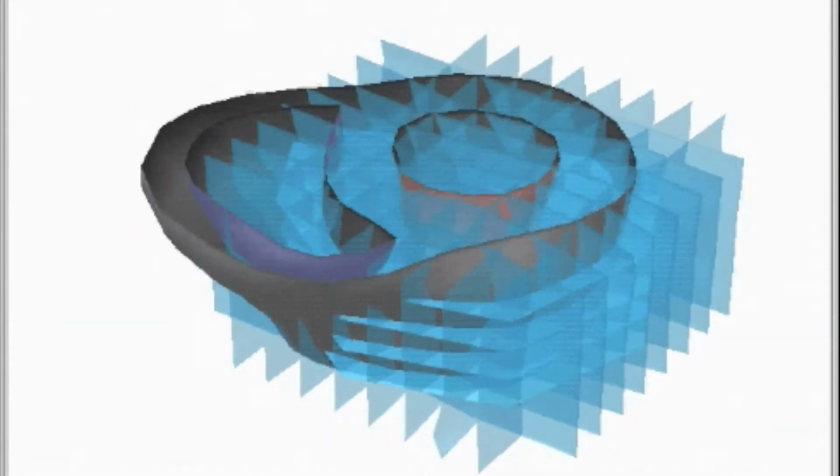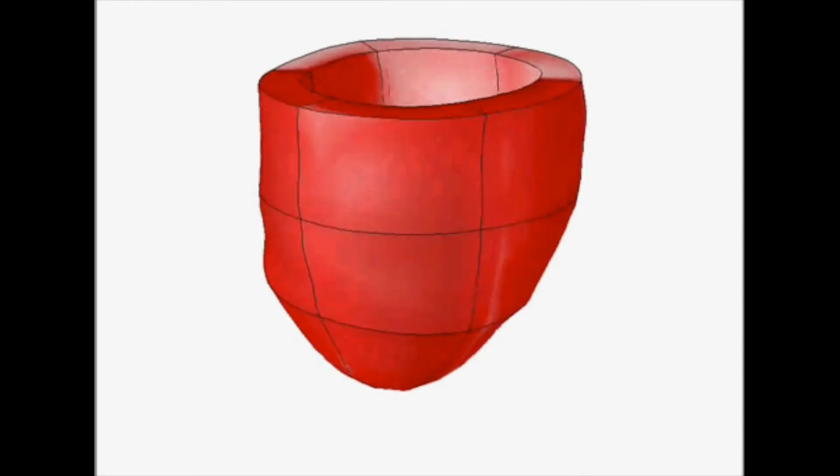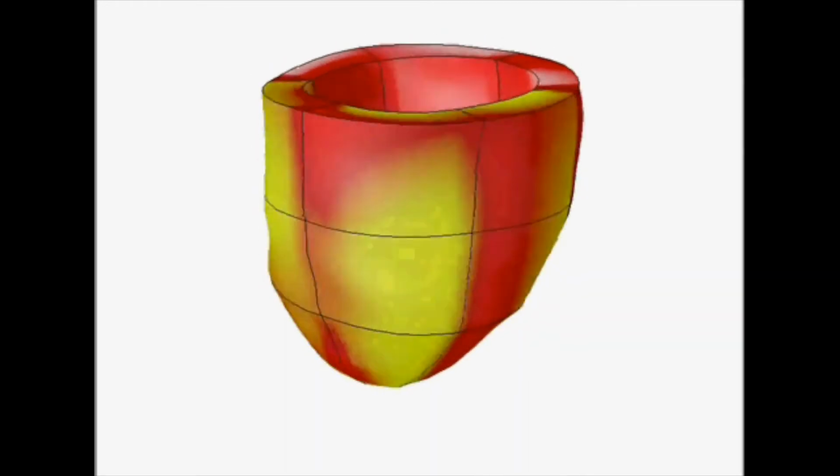The short and long axis images are compiled into a four-dimensional deformation field that tracks the tagged planes in 3 dimensions through a complete heart cycle. The strain algorithm measures and calculates how far and in what direction points on and within the heart muscle move through a complete heart cycle. This image is hard to interpret, however.